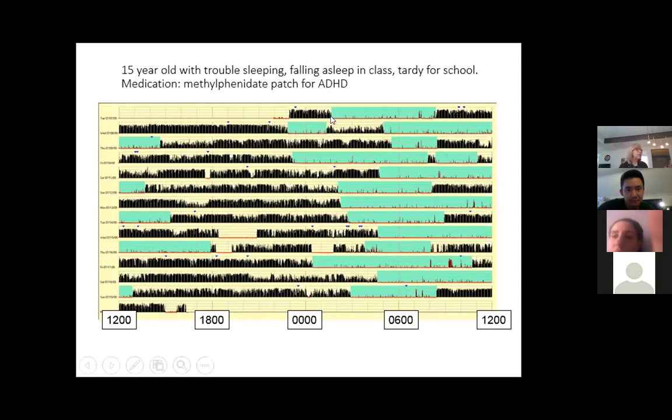It's all over the place, isn't it? Yeah, generally between 12 to 2-ish. There's not really a good average, is there?